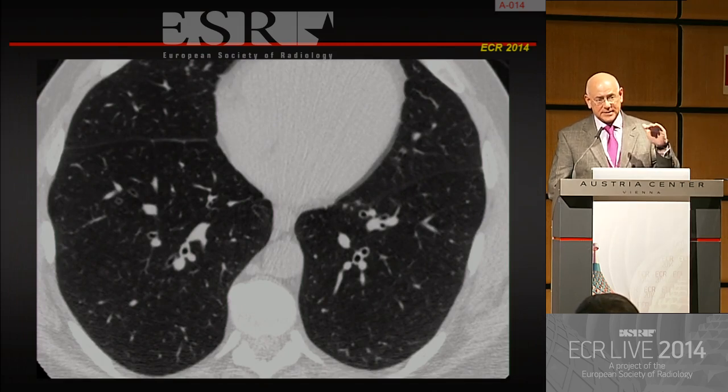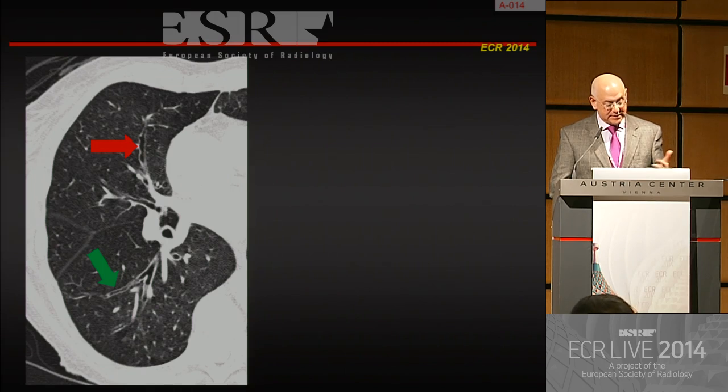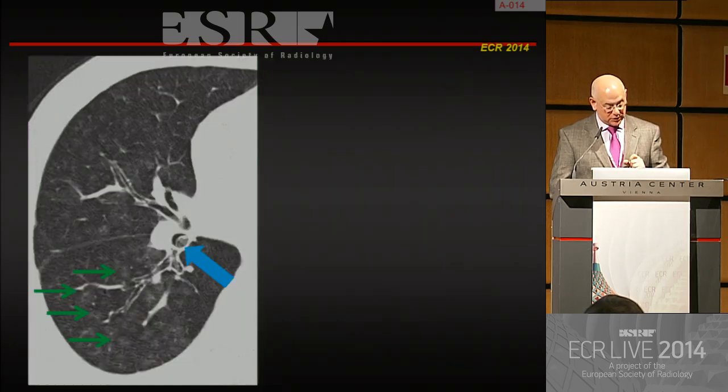If you look at scans of these patients in cross-sections, you see a coexistence, if you want, of normal bronchi and bronchi that clearly have thickened walls. This results from the thickening, from the hypertrophy at the histological level caused by glandular hypertrophy. And you see the same if the bronchi are really running in the scan plane. You see the slightly dilated, irregular bronchi, as indicated by the red arrow in this image. And sometimes you even see the mucus plugs inside the small airways.